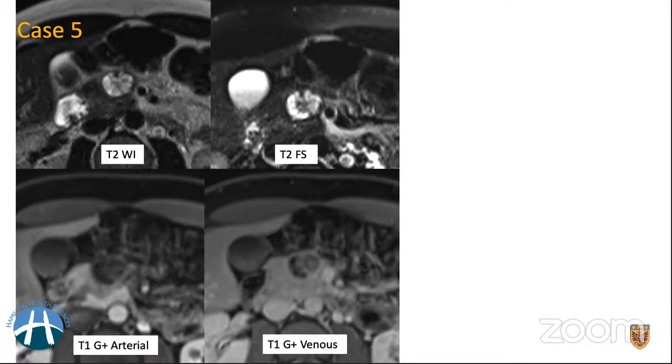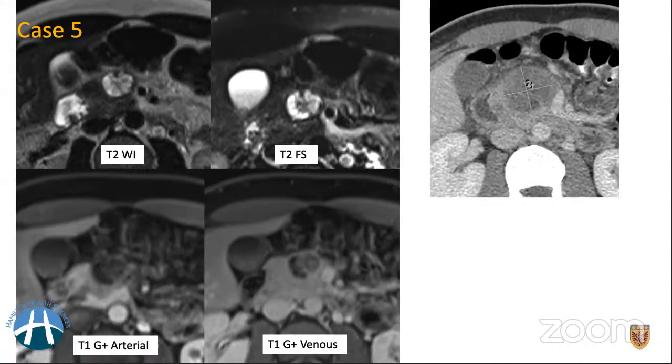The only problem was that on follow-up CT, the mass grew twice in size as compared to what it was before. And then it was decided that this particular lesion has to come out. Before we go into that, I'm going to show you one actual image and see if somebody wants to include something else on the differential.